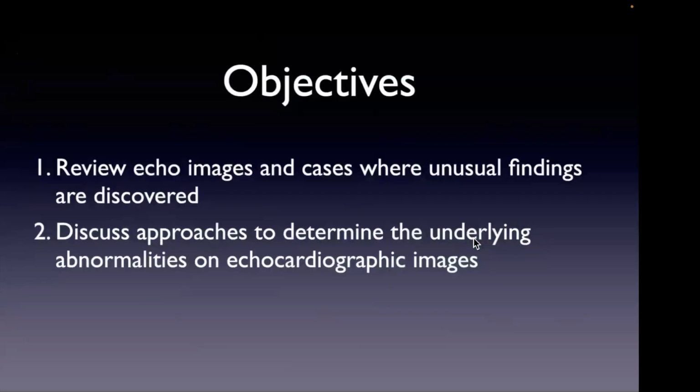All right, so these are the objectives. We're going to review echo images. Sometimes they're going to be short snapshots to get people to think about what they're seeing and what it could be, and how they would go about further delineating what structure, what abnormal flow we're seeing. But sometimes they'll be more comprehensive cases. I think I should have enough to fill a good 15 minutes or so. And then discuss, and you'll see us implement some approaches to determine the underlying abnormalities that we're seeing.